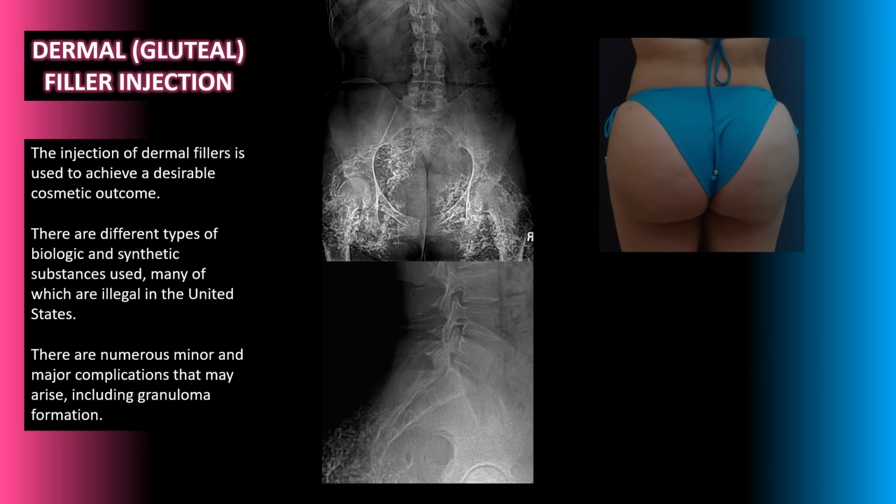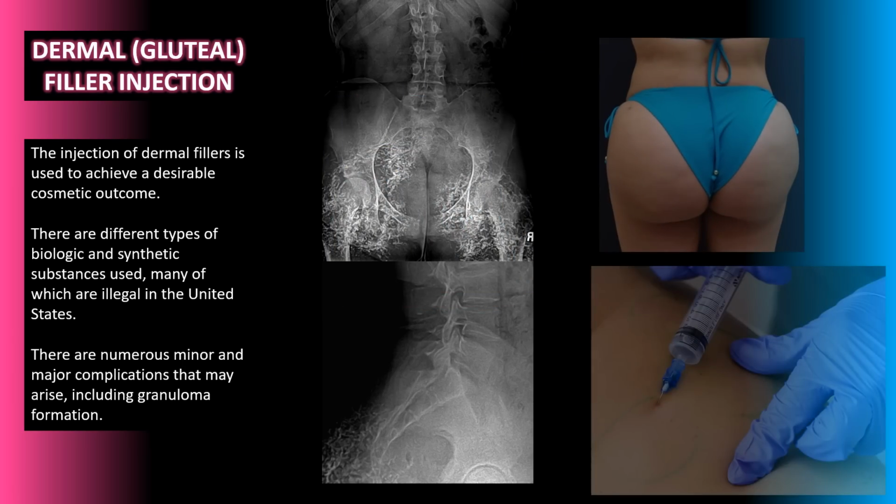The injection of dermal fillers is used to achieve a desirable cosmetic outcome, and there's all different types of biologic and synthetic substances which are used. And there can be minor and major complications that can arise, like granuloma formation or visibility of these densities on X-rays.